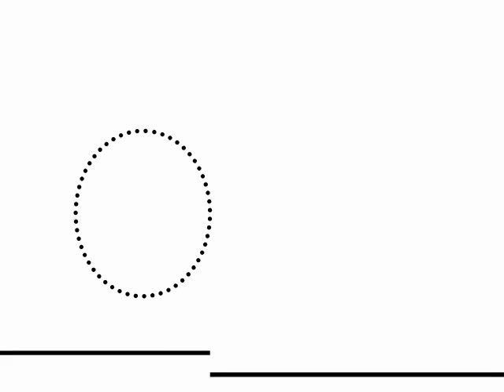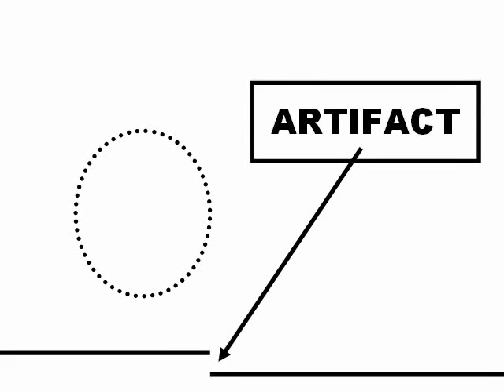That produces an artifact like this. The areas that are behind the faster areas appear nearer than they really are.